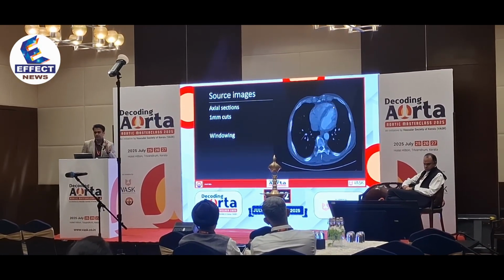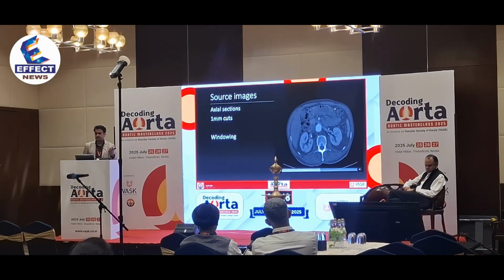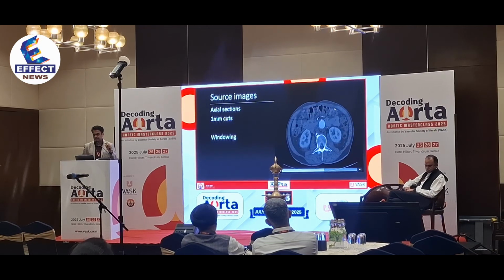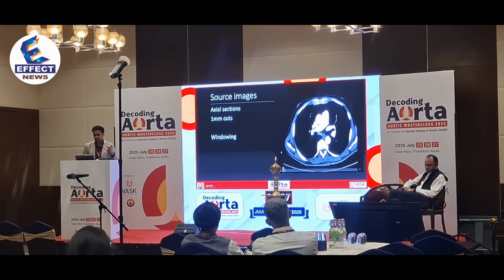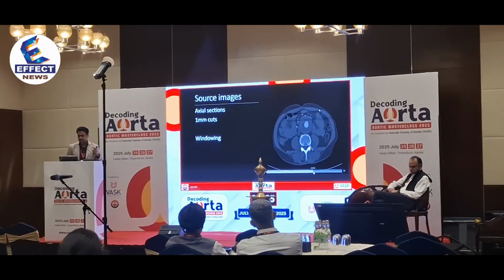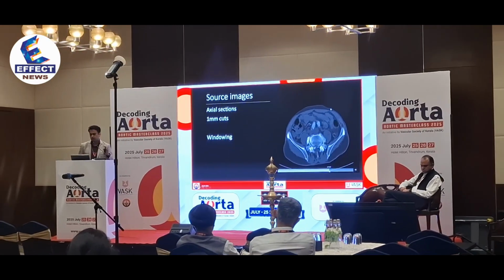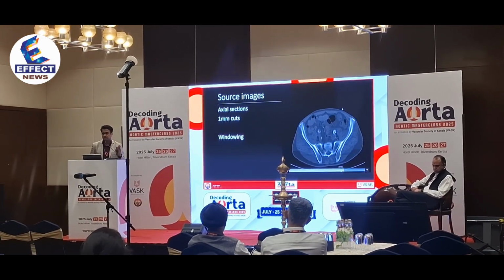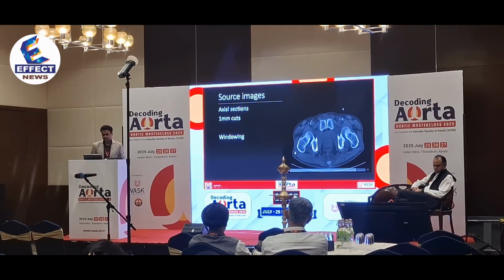So this helps you in two ways. Number one, it reduces glare to your eyes, and number two, you can also differentiate the contrast and the calcium in the arterial wall or the vessel wall much better. So you can see here in this picture, in the iliacs particularly, there is dense calcium. You would not see this if it was an unwindowed image. So you can differentiate calcium and contrast very well, and also the thrombus is much better defined.